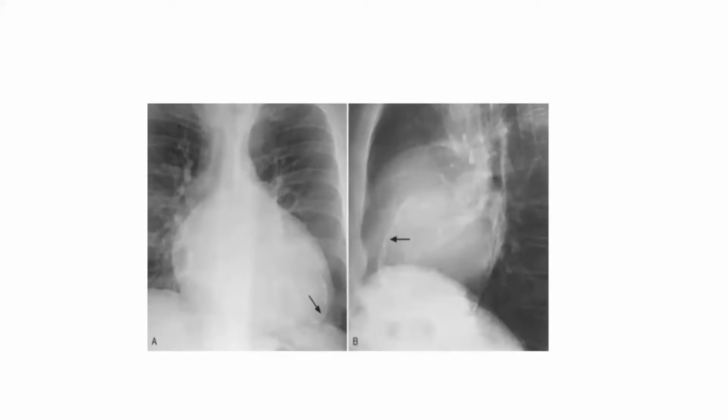Yes, this is not pericardial, because you see, the borders of the heart are here. These are the borders here. And this one is encircling some other place. This is the location of what? LV apex. So if you see a curvilinear calcification density along the apex, what are you suspecting then? This is apical aneurysm with calcification.